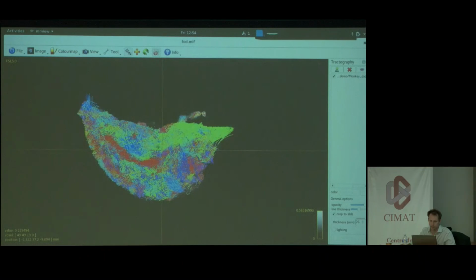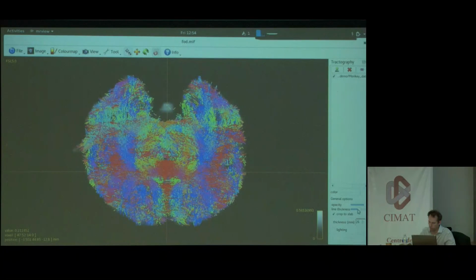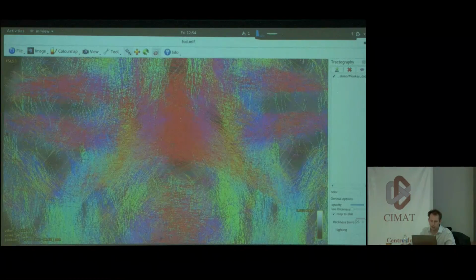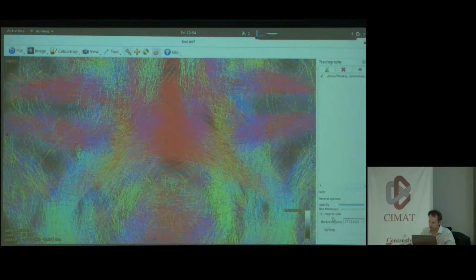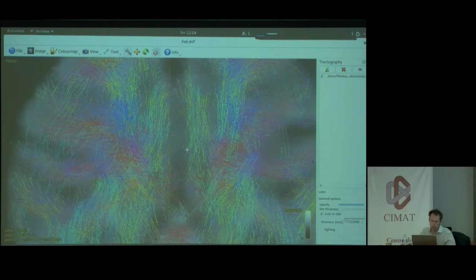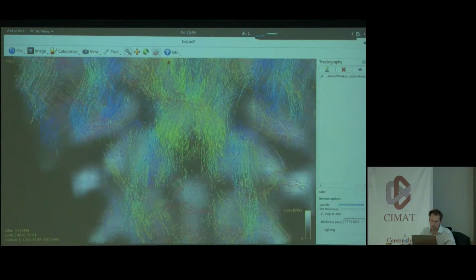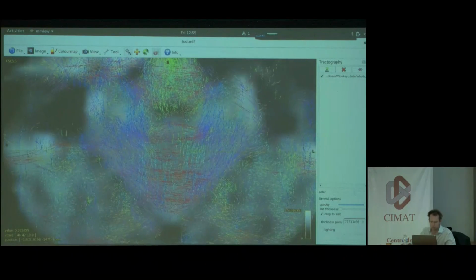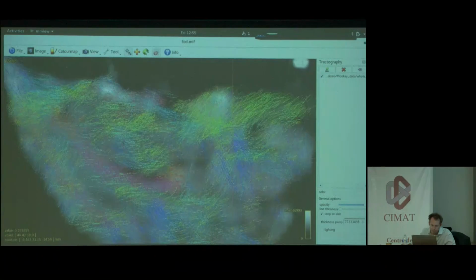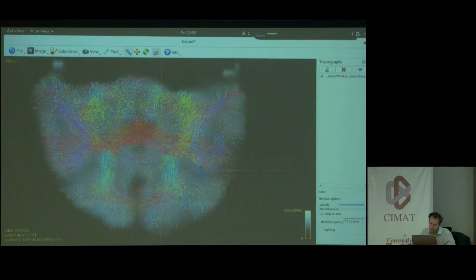Oh, it's messy. That is pretty messy. I've seen cleaner data, I have to say, but I'm trying to figure out why they would have so much.